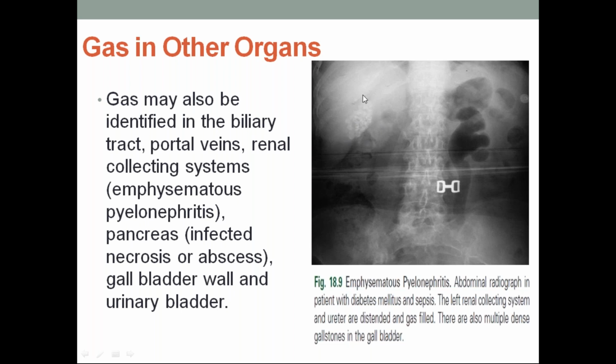They are calcified gallstones, which is why we are clearly able to appreciate them on a plain abdominal radiograph. Normally in this area, if any biliary tract perforation is there, you will identify it.